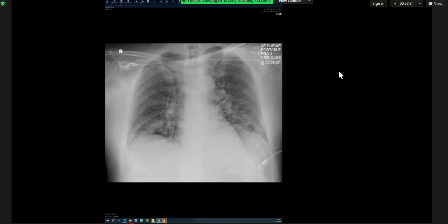So this could represent again cardiac failure. Nodules in cardiac failure? No, I think they are vascular markings, prominent vascular markings. Okay. So if you're saying all of these are end-on vessels and this is just pulmonary congestion, if that was true, why does he have an ETT and why is the heart not enlarged?